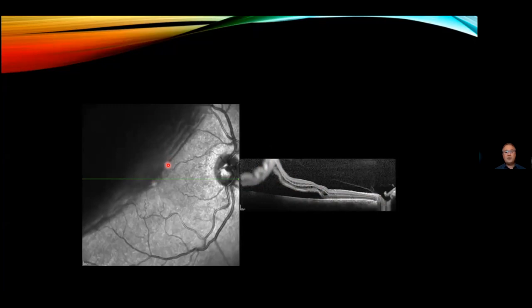And if I go and operate this patient, it's important to note that the vitreous is still attached to the retina. So this is going to be technically a very difficult procedure because I need to get the vitreous off first, and then I can attend to the detachment.